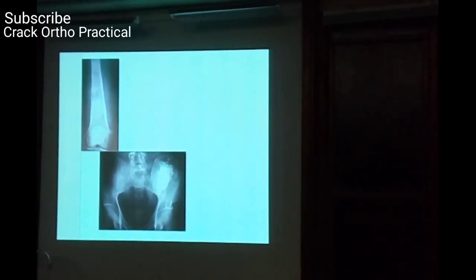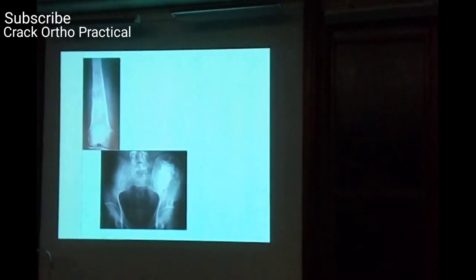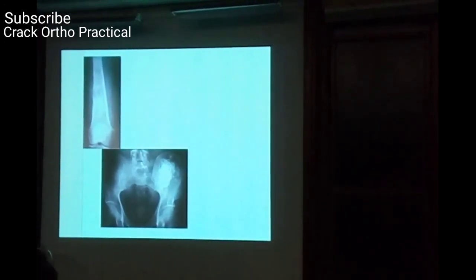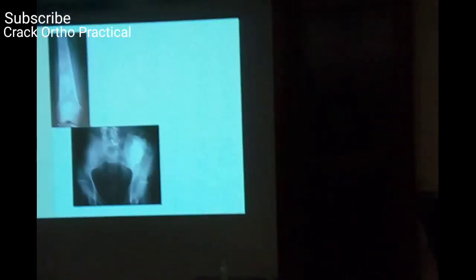Okay. Ill-defined. No periosteal reaction.